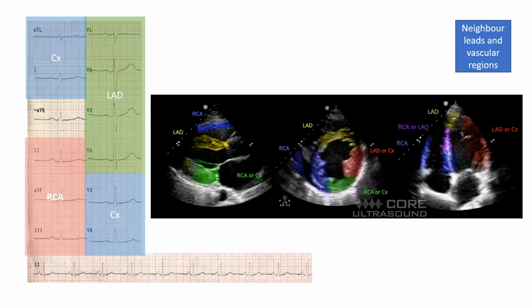All right, back to the good old Cabrera ECG here, and this is where the vascular territories may be placed. The RCA is inferior still, the circumflex around here, and then the LAD. And I think these are important, especially if we can correlate them to hypokinesia in the heart, right? Hypokinesia is quite hard to see on POCUS, I think, and it's definitely a next level thing. It's not just basic POCUS.